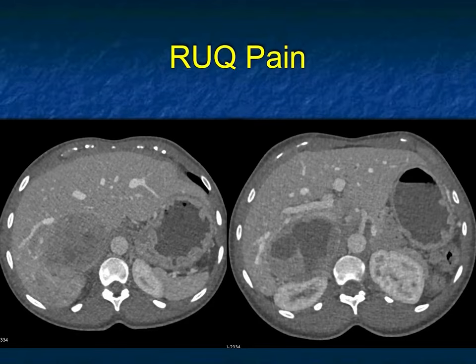This patient has right upper quadrant pain. The lesion is in the region of the right adrenal bed. Yes, you want to make sure it's not coming off the kidney. Yes, you want to make sure it's not coming off the liver. But it looks like it's simply pushing. You would look at the coronal views, maybe the 3D imaging. Now, if this is adrenal, what could it be?